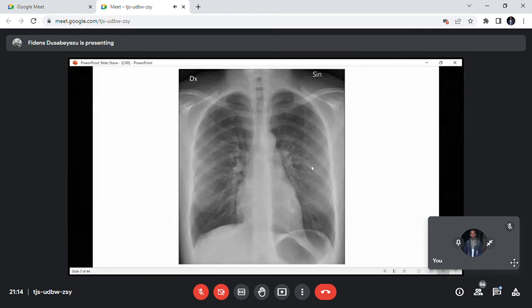you have to think twice and say, maybe there is a superimposed mass, and that mass may be lymphadenopathy or any other mass. Okay, that's one. Question: where is the concavity? Concavity. Don't you know what is called concave? Concave and convex. You don't? But I can't see it on the hilum. You can't see it. In radiology, we discover things that are not that clear. That's our role, by the way.